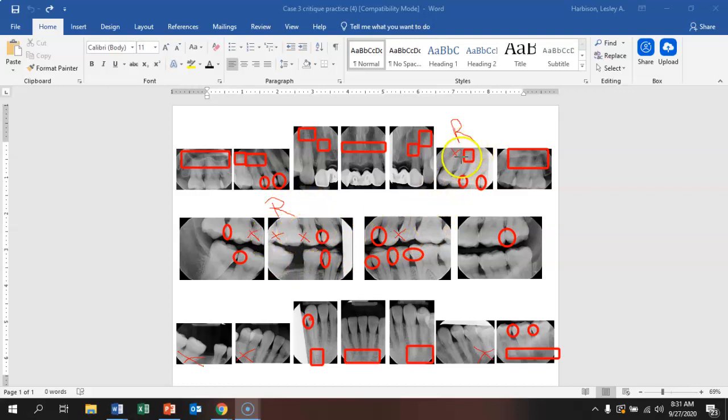So I got one retake here where I'm going to try and open up both of these contacts, and then I'm going to do one retake here where I get the apice and I open up the contact. And then down here, we have the canine already, so we don't have to try and go too far, but the chances of getting this wisdom tooth and the premolars in one shot, because we have this gap, is not very likely, so you'll probably need to take 2 retakes, one with the molars and then one with the premolars.